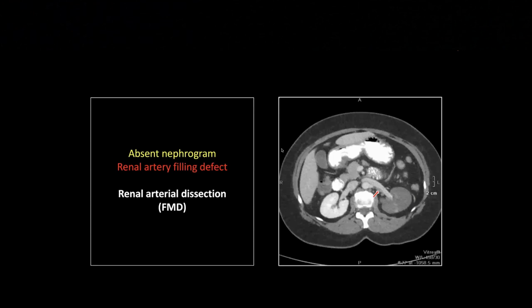And of course, here you're thinking, well, could this be thromboembolic? And I went up and looked in the heart. The heart's perfectly normal. There's no intracardiac clot. And I was stewing over it and said, well, I guess I just don't have a source. And what I should have thought of is a local entity in the left renal artery, perhaps giving rise to, say, an aneurysm or a dissection, giving rise to thrombosis in situ.